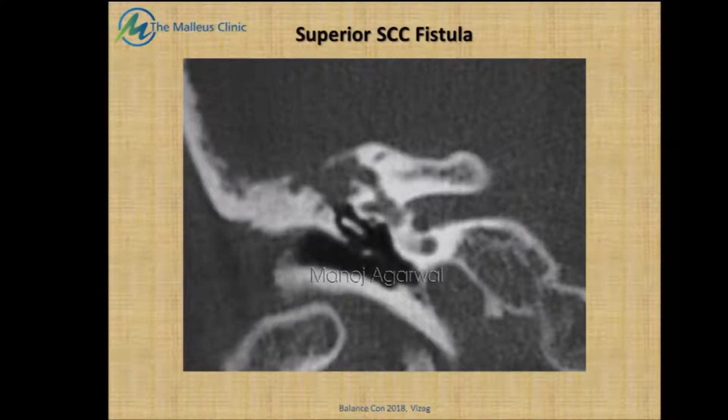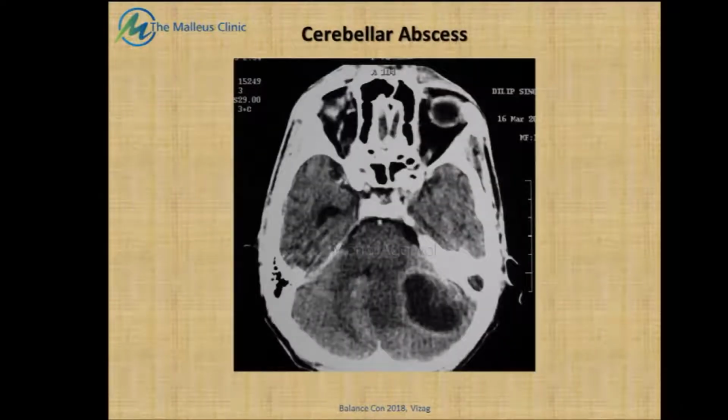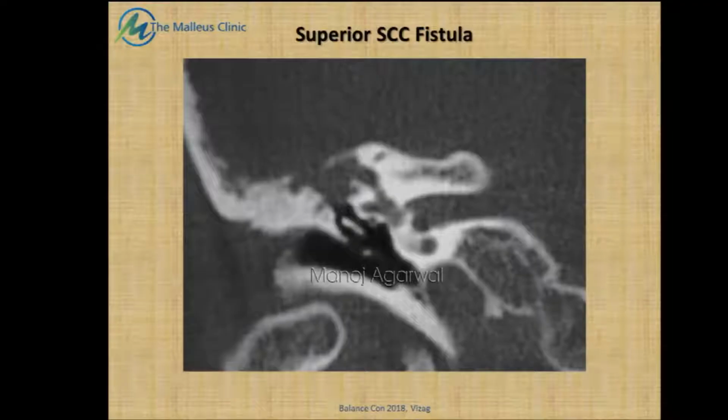It's not a petrous bone cholesteatoma. It's not an extensive petrous bone cholesteatoma. It's a small cholesteatoma in the attic region, eroding the tegmen and the superior semicircular canal. So that patient too would present to you with dizziness, right? So, right. That was as far as the intratemporal bony compartment was concerned, correct?